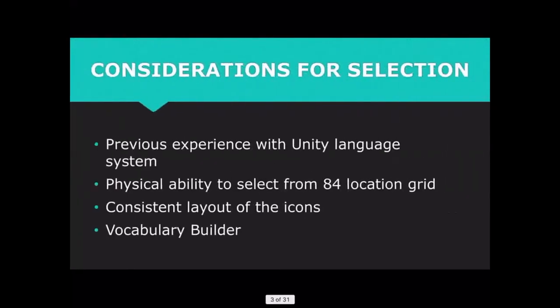So, considerations for this app. If somebody wants to use this application, it really helps if they have experience with the Unity language that was created years ago. It's designed to be more of a muscle reflex where you move your arm and your hand, and your muscle tone helps direct you where to go on the page, because the buttons with the language are always in the same place.